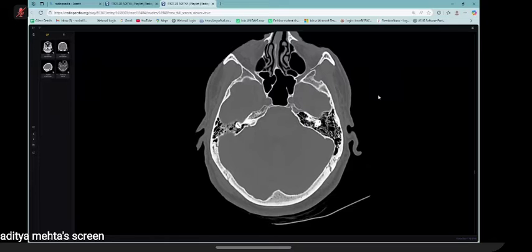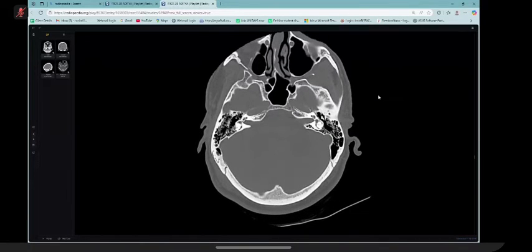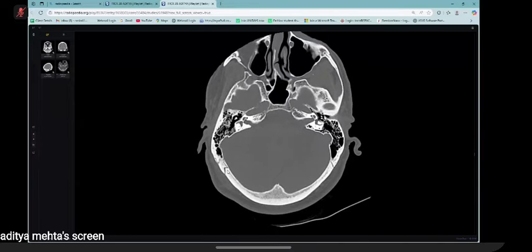You said arteries. What are the others? Veins. I should look for veins as well. Sir, this area, they are not symmetrical.